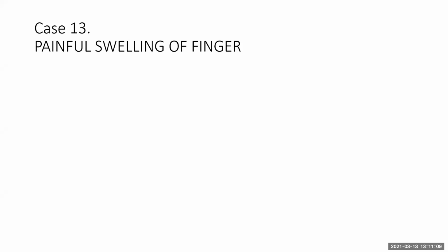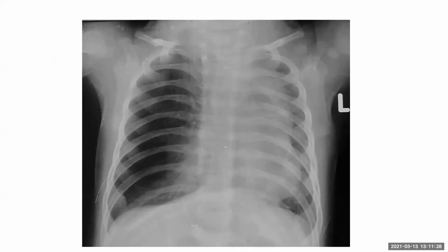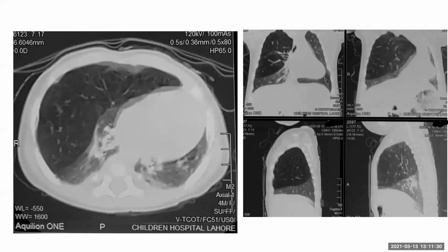Right. Yes, I think we would make this the last question: should we mention ultrasound scan as the next step in hernia, or clinical examination by the surgeon? I think this film had a very obvious hernia, and this should be a clinical examination by the surgeon. Right, madam. Thank you so much. Again, a wonderful selection of cases, madam.